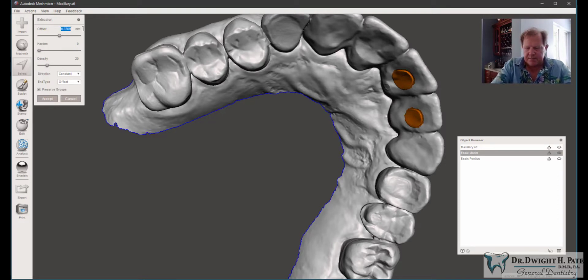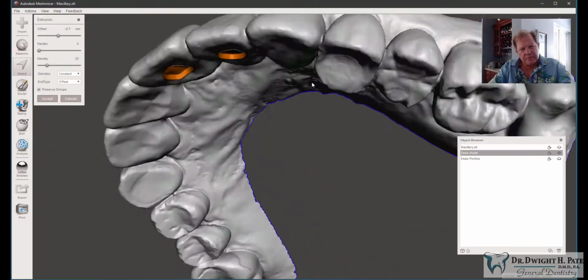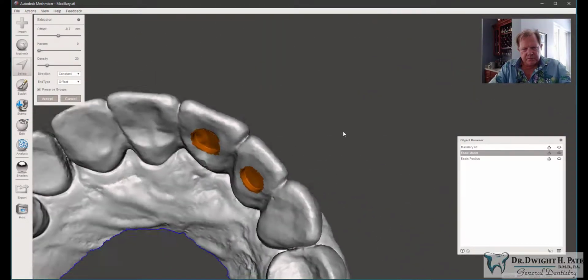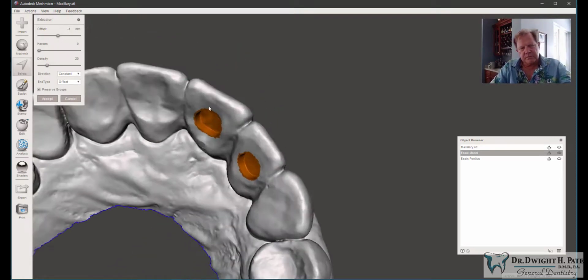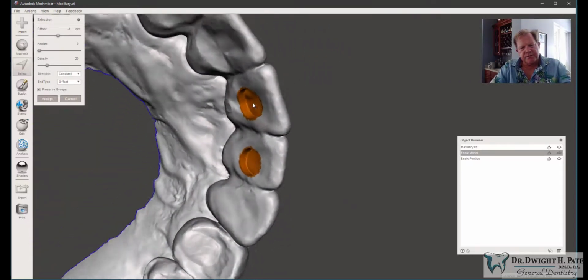approximately minus 0.7. Let's try minus 1. You can take it as deep as you want.